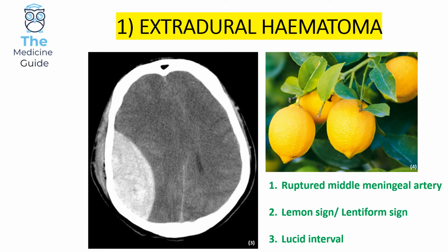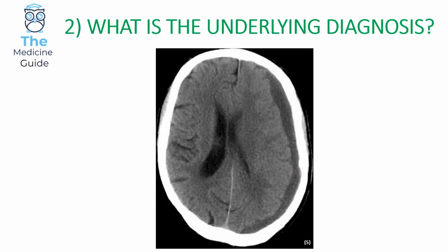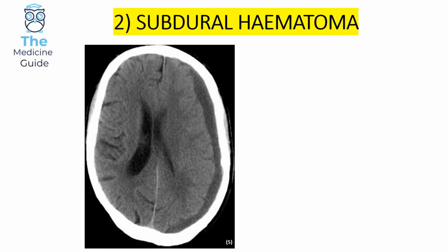Okay, let's have a look at the next question. You can either pause the screen at this point or wait 10 seconds, the choice is yours. Okay, let's find out the answer. So this is an example of a subdural hematoma.